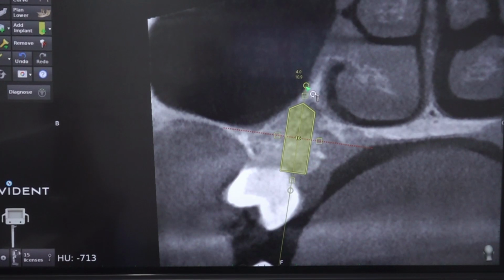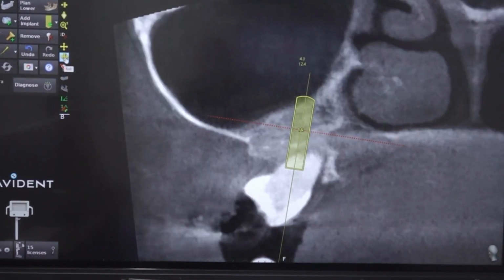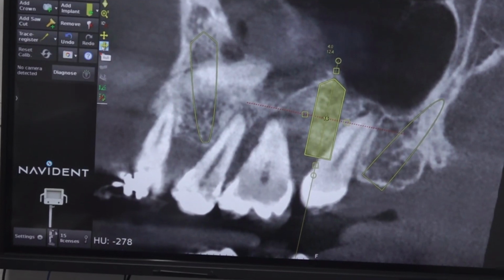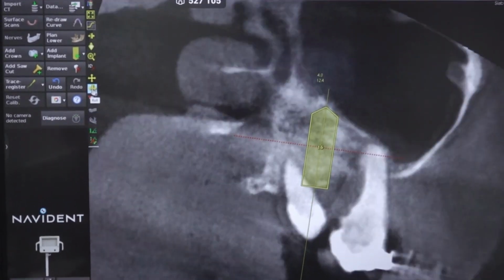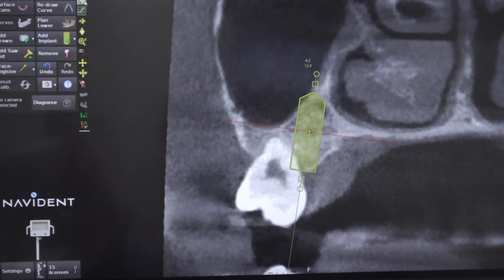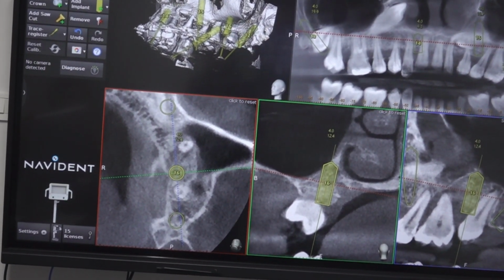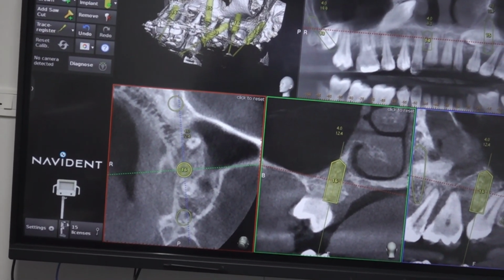Slightly towards the maxillofacial side, you will get a little longer length. Okay, it looks okay, just in front of the 8. But of course, we are going to place a pterygoid also. These two will interfere with each other, the scan bodies, everything.